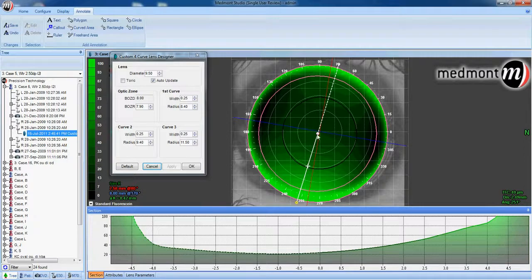And we can see that this patient has a fair amount of tear layer clearance heading toward 12 and heading toward 6 o'clock. Dotted section of the line here corresponding with the dotted section of the line here. Solid section of the line there corresponding with solid section here. If we click our cursor at the edge of the inner pink circle, which is the optic zone junction, we're showing 41 microns heading north and 85 microns heading south or inferior.